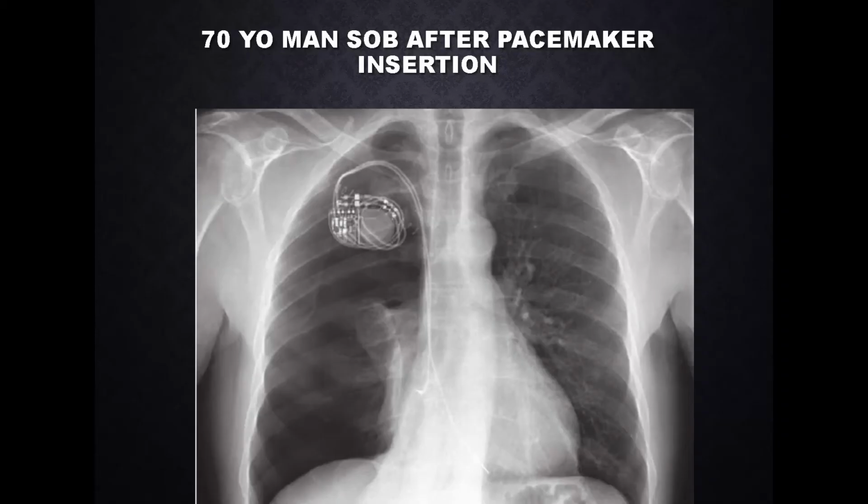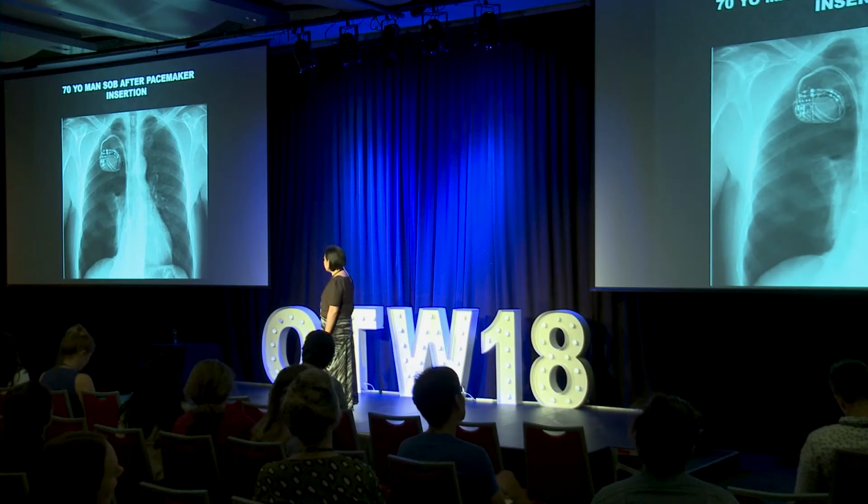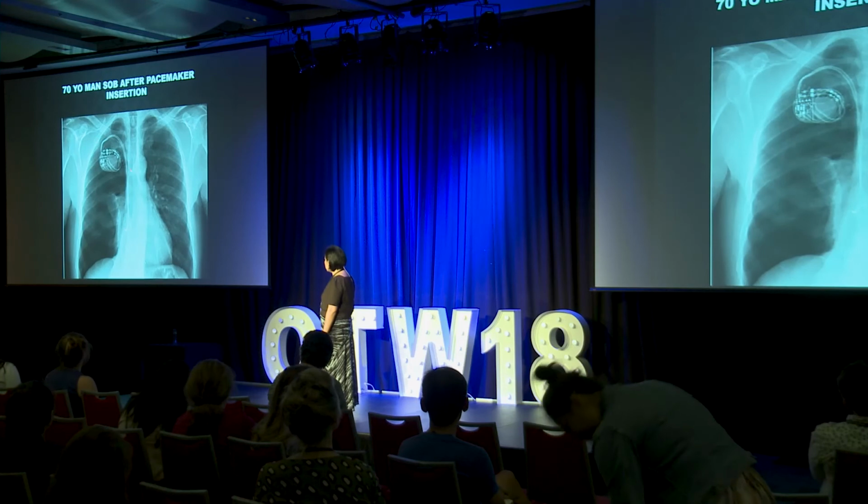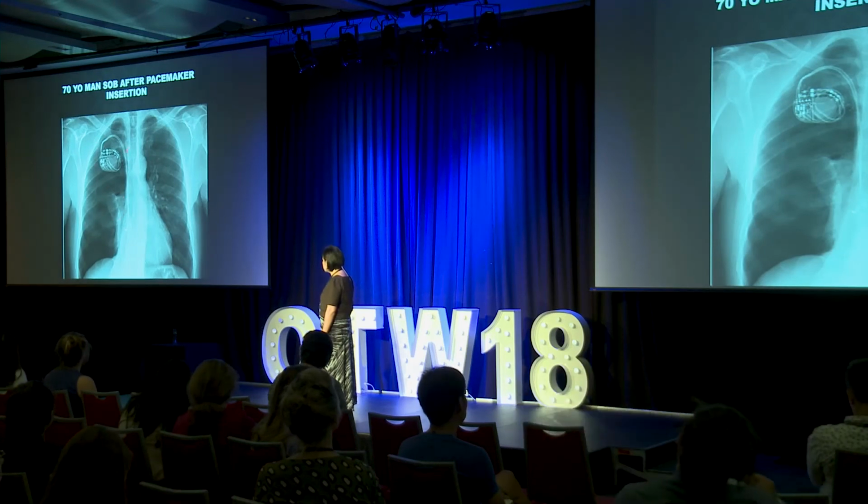Next patient. This is not uncommon for what we do. The patient will be from cardiology. They come in for a pacemaker insertion. They put the pacemaker in and ask us to do a chest X-ray. So two things we look for will be the position of the pacemaker leads, making sure that it's all intact, there's no broken leads. So you basically have to work out how many leads there are, and then trace all the leads to make sure there are no broken bits. And you also want to make sure that it's in the right place.